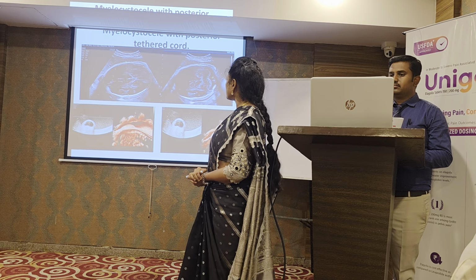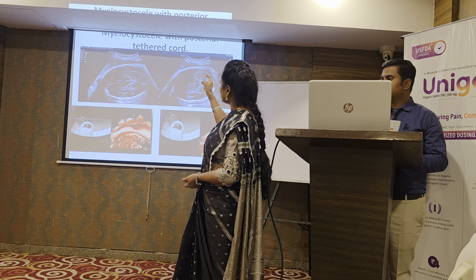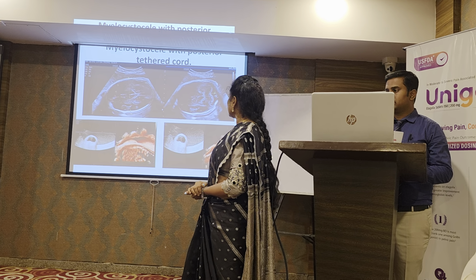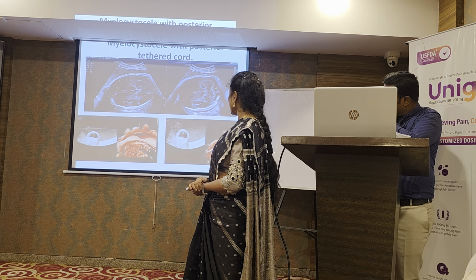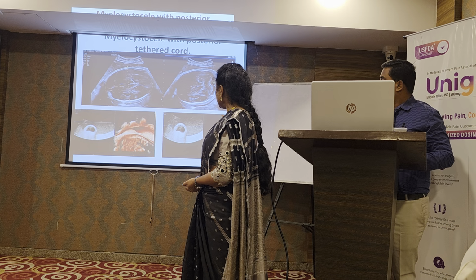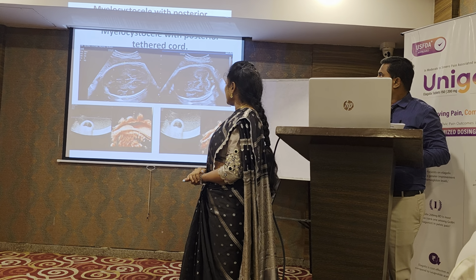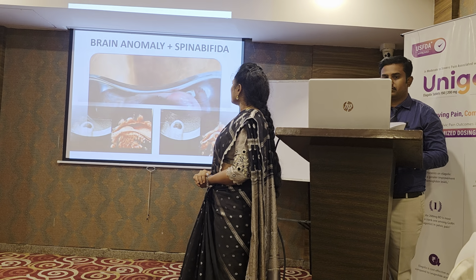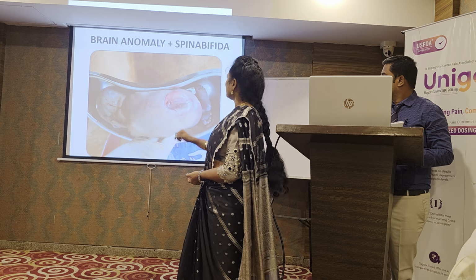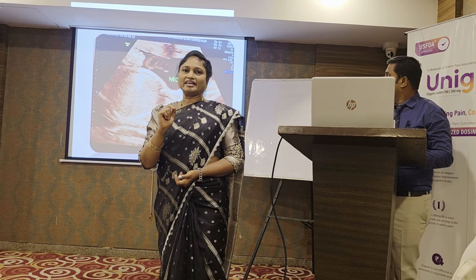So this is myelocystocele with the posterior tethered cord. Because of the tethered cord, there is pulling of the posterior fossa, and there may be some degree of herniation into the foramen magnum. There is a nice cyst in the lower part of the cord, almost in the lumbosacral area. Next one. So this, we had to abort this baby, and this had a meningomyelocele with the cyst. Next one. So next we are coming to the neck.